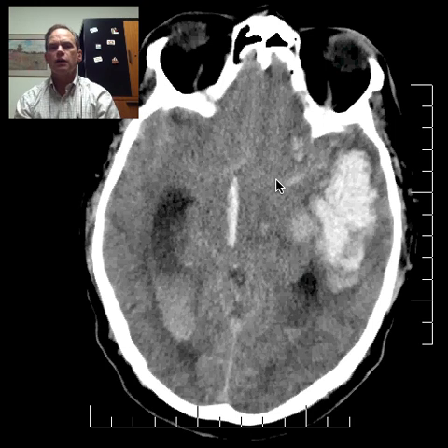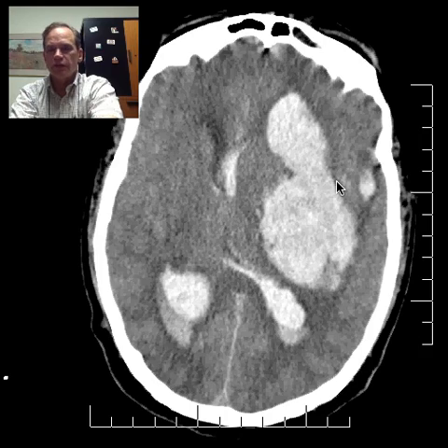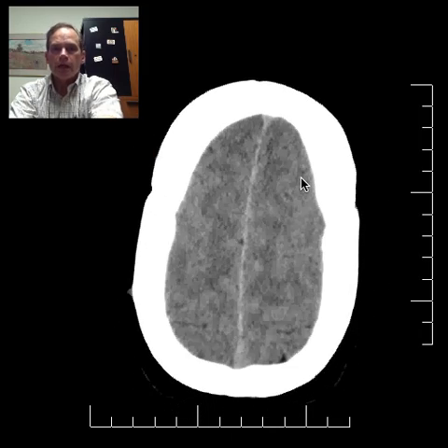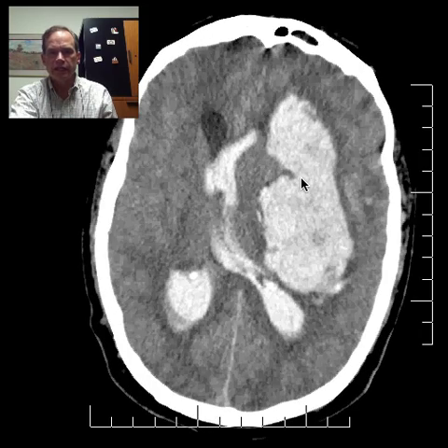So besides having the changes in those very small perforating vessels that are coursing superiorly from the middle cerebral artery, you have the high blood pressure itself. And with time, the two add up to an explosive event like this. This is about as big as it gets, and that for us is going to be helpful in understanding some of the mass effects that we see in the head.